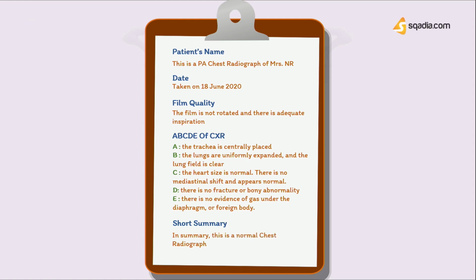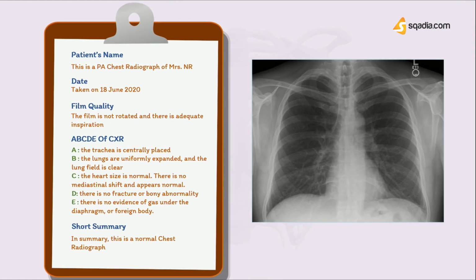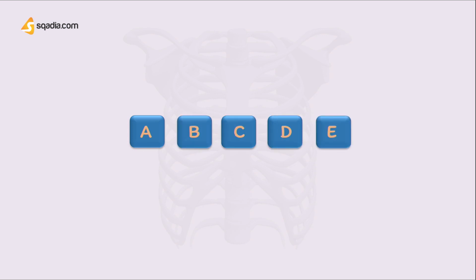All right, guys, so now we're done with the normal chest X-ray and how to read it. Next, we're going to go into the ABCDEs in detail as well as discuss some important radiographic points on common pathologies, so keep watching. Now, there is no one way to go about approaching a chest X-ray, but it's probably a good idea to go by the ABCDE approach we just mentioned.